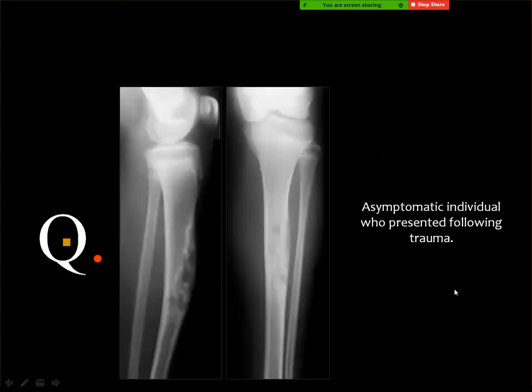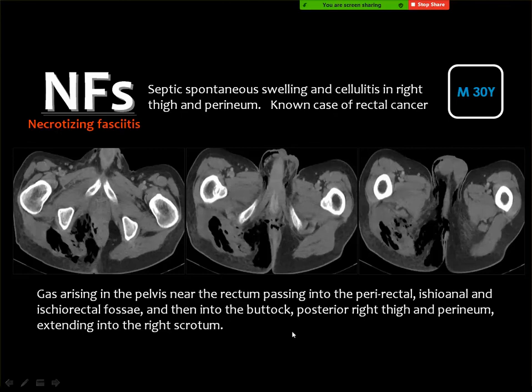Dr. Mamdouh, in MRI for necrotizing fasciitis apart from air, what are the features we can say in MRI this is necrotizing fasciitis? Actually, in MRI, if you do not see some air, although air is not a standard feature of this disease, you get extensive inflammation like those seen in diabetics, where you get diffuse soft tissue edema and loss of the intermuscular and subcutaneous fat planes, and abnormal increased signal in the T2 with heterogeneous enhancement after injection of contrast.